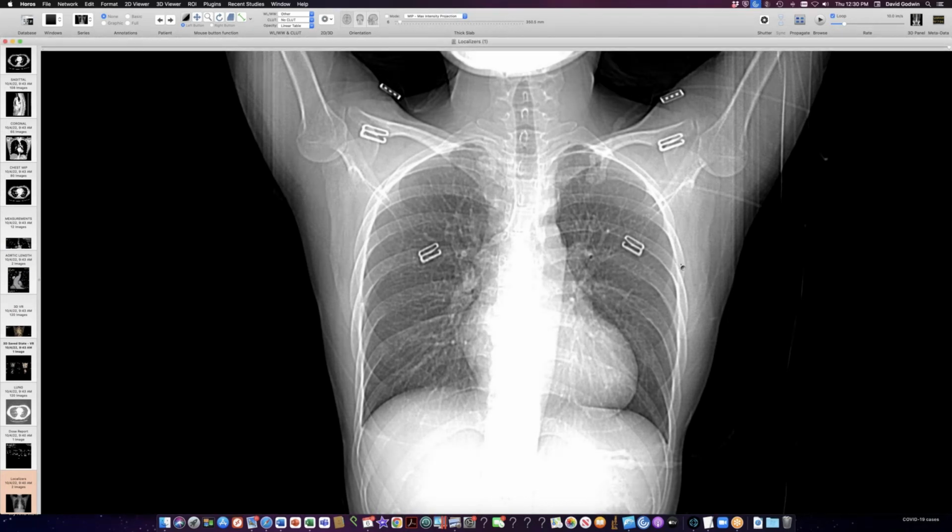So this case came through yesterday. I think it's a woman in her 30s. She has a history of coarctation, and I'm not seeing any screen yet. Oh, there we go. Is it visible? Yep. So I'm showing you a scout view from a CT scan. This woman has a known coarctation, but she's never had any intervention, and the only imaging study we have is yesterday's CT scan.